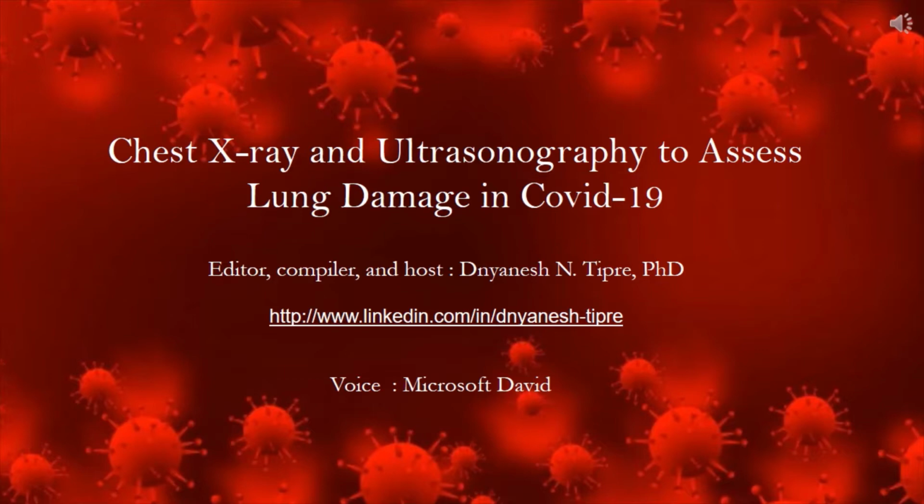The slides will show lung abnormalities on chest X-ray and corresponding ground glass opacity on chest CT. It would demonstrate abnormal pleural lines, A lines, consolidation, and B lines on lung ultrasonography. The corresponding lung damage on chest CT would convince rationale and importance of both portable radiography and lung ultrasound to assess lung damage in COVID-19.